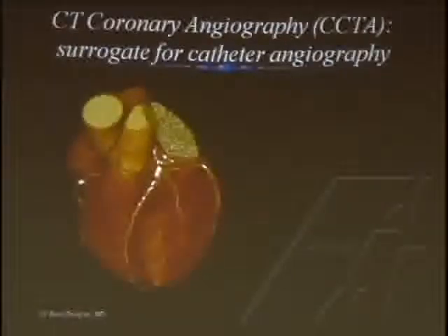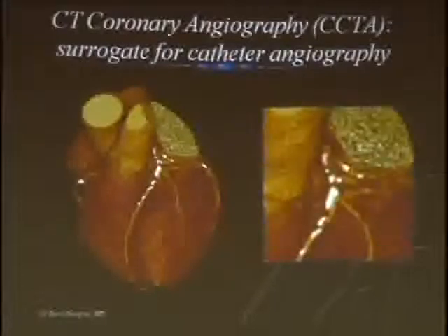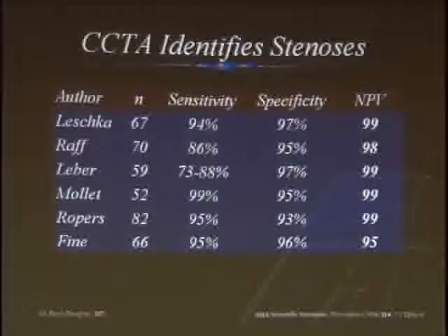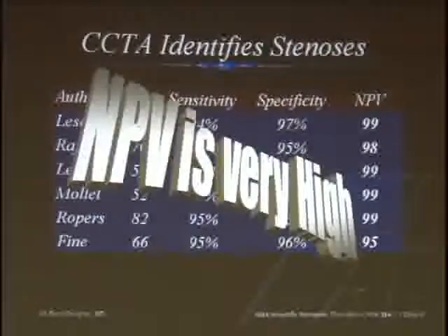So we do an angiogram, which is basically, we inject the patients with contrast, and we use fancy 3D rendering to try to recapitulate what it would look like in the cath lab. So these are all CT images, and we're trying to do basically a surrogate for coronary cath so we can get the same data. And what we found is, again, negative predictive value extremely high when it's a negative test. Our pictures tend to overestimate the amount of disease. So if it's a negative angiogram, it tends to be very accurate.